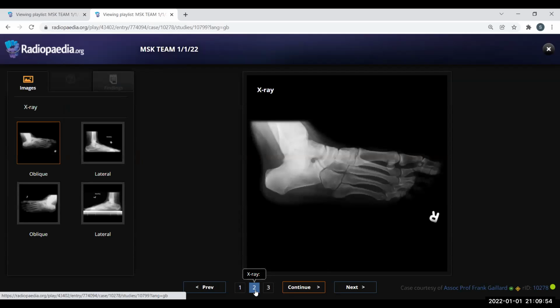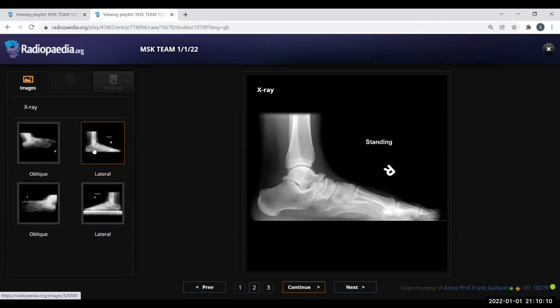14-year-old female, painful feet. You can see all the views at your discretion. Okay, I've been provided with an oblique projection of the right foot. See all the radiographs, Dr. Mahak, once, and then you can start describing. Okay, I will first describe this.